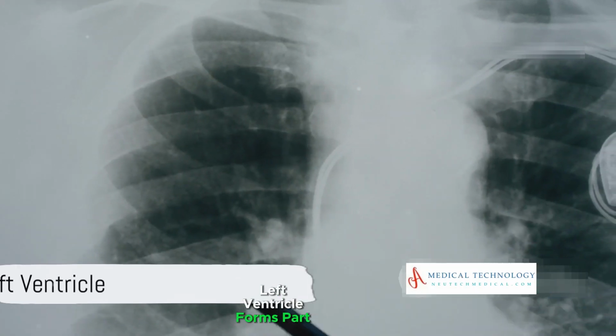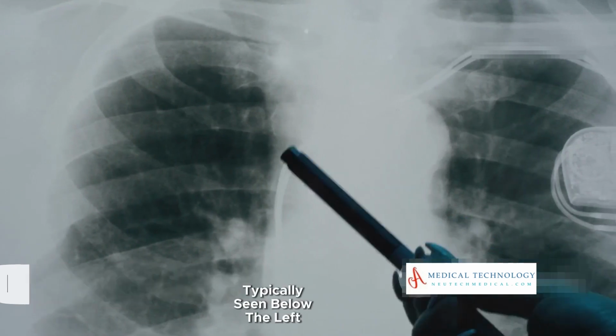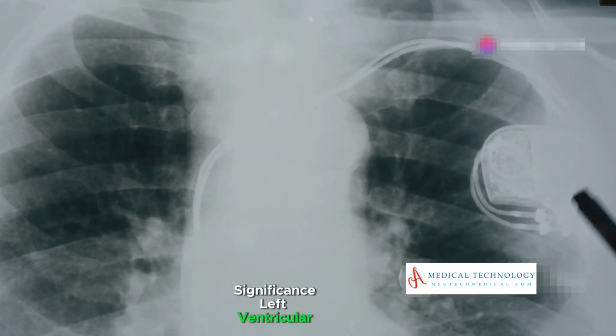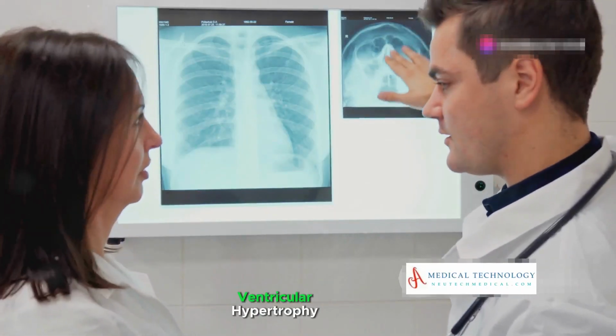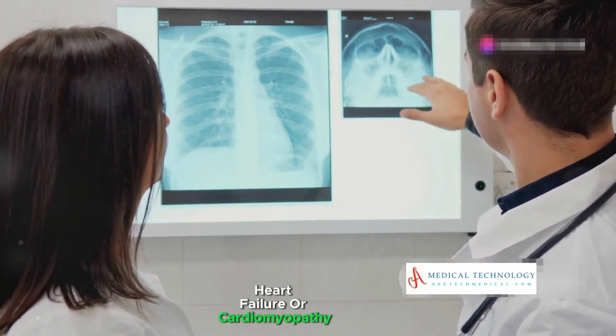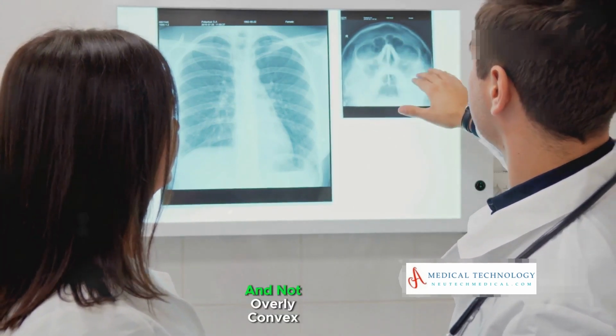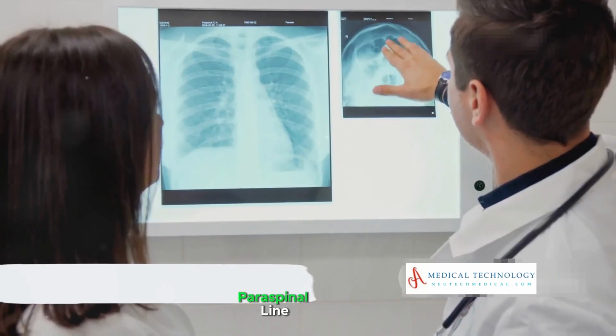Left ventricle forms part of the left heart border, typically seen below the left atrial appendage. Significance: left ventricular enlargement may suggest left ventricular hypertrophy, heart failure, or cardiomyopathy. The left ventricular border should be smooth and not overly convex. Paraspinal line.